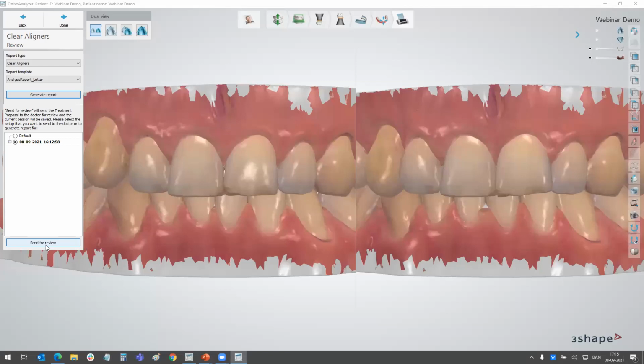Then we have a question: is the waxing model tool using an insertion direction, I assume is meant, and more precisely stamping only X quantity of wax? I'm not quite sure I understand all the nuances of your question, but regarding the insert direction, only for the overhang wax, remember the one where I chose a tooth, that one is using the direction of that particular tooth.